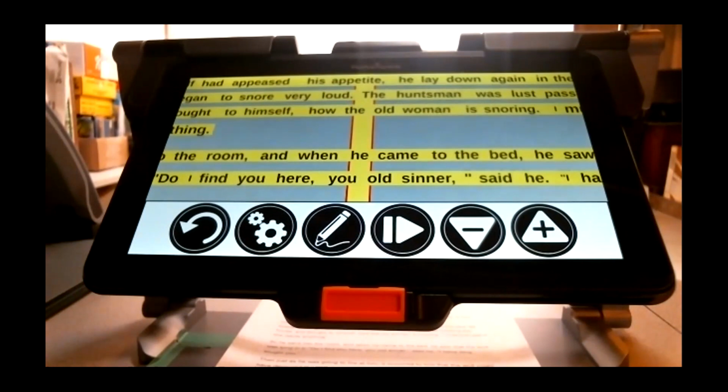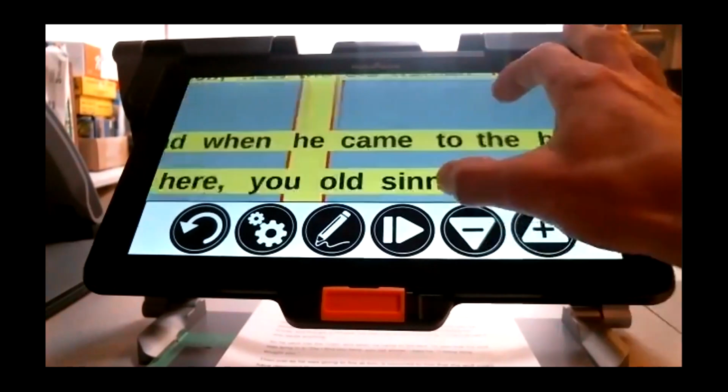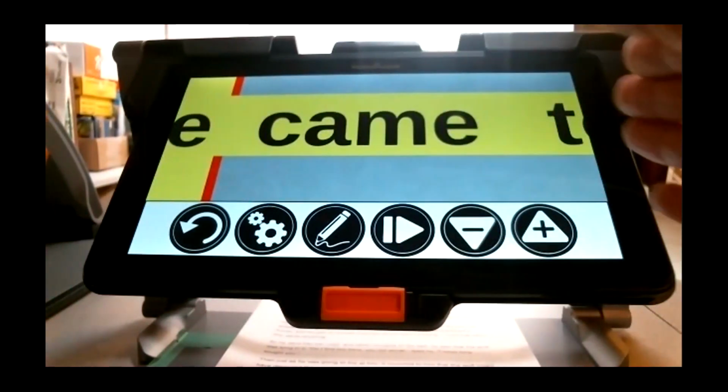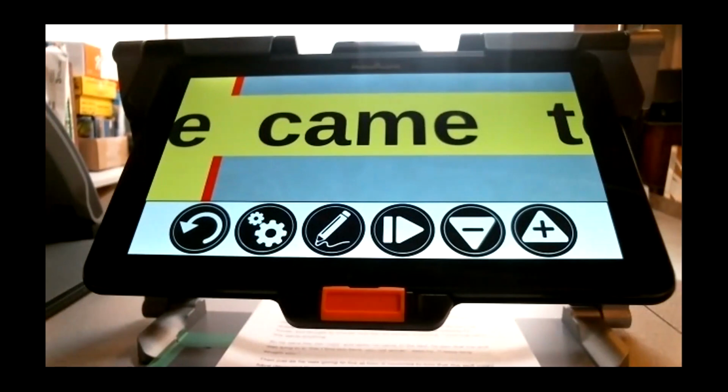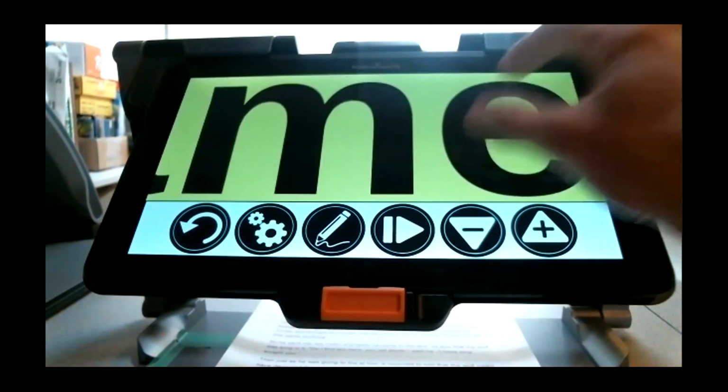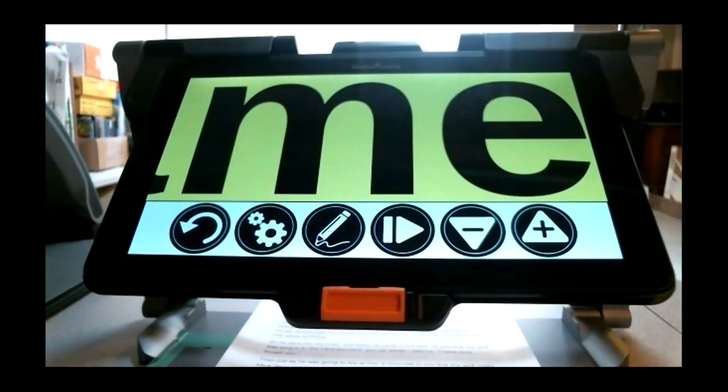Diamond Edge is used in all our marketing documents at Humanware. It just says Diamond Edge is really, when you look at a diamond, it's crisp and clear, nice clear cuts. Well, this is what you have here because we've replaced all the text in my captured document by what's called vectorial text or computer font. So I can zoom in very, very high, at a high level, without loss of any image quality. So that's why we have Diamond Edge, very crisp image quality.